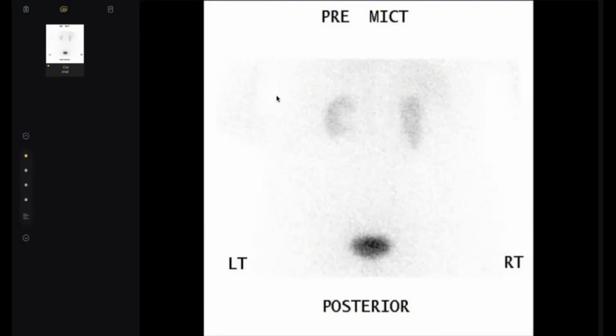Very difficult, doctor. Is there uptake or not? There's uptake, but I can't see it. It looks like the normal one. Yes, by the way, this is not anatomically oriented at all. So there is a photopenic area. You are very correct here. You are excellent.